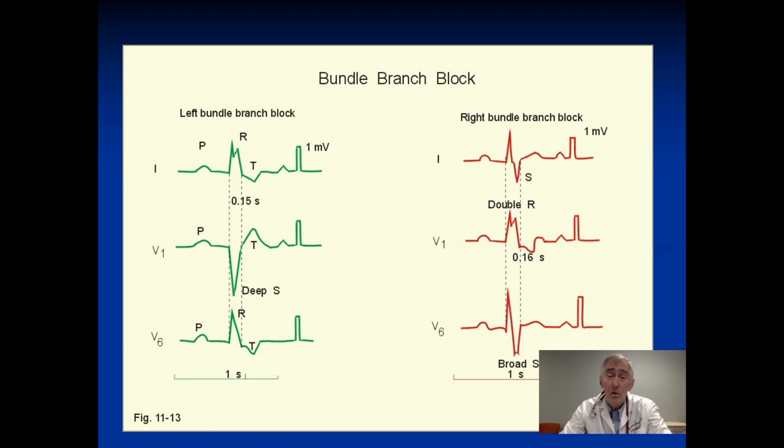And if we turn the paper 90 degrees clockwise, lead V1 points to the right, whereas, as you see, lead V1 in left bundle points to the left. That's just a little trick. Again, don't rat me out to the cardiology community for being too simple.